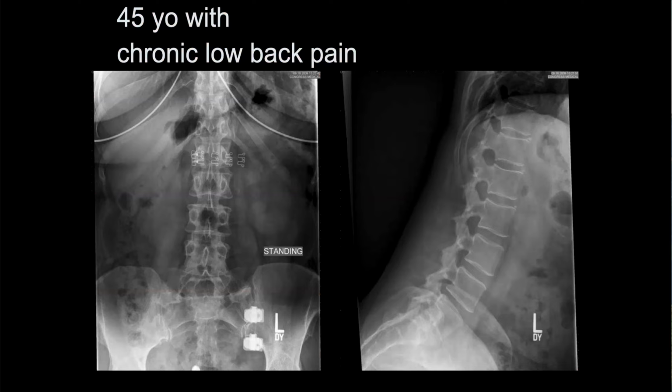45-year-old with chronic low back pain. Yeah, it looks like maybe on the AP radiograph, you said fusion of the transverse process of L5, bilaterally. Yeah. And it's nice to have plain films on these so you can count down 1, 2, 3, 4 vertebral bodies here. So this would be 5, but we can see on both sides this vertebral body is articulating with the sacral elements here.